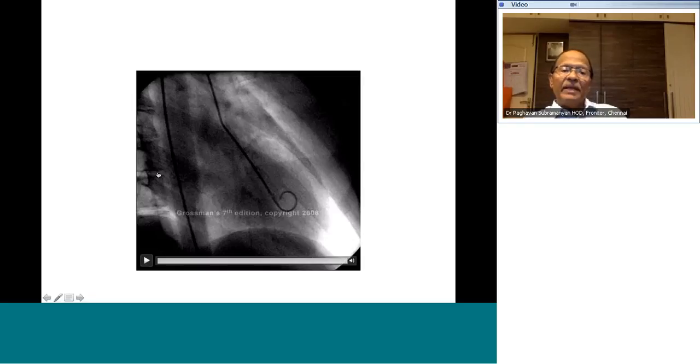If the spine is close to the left border of your image, and your heart forms an ellipsoid with the apex pointing down and to the left of the image, you have to remember the shape. Because here you don't have the whole chest, you have to remember the shape of the heart. It forms an ellipsoid pointing towards the left lower corner of the image.